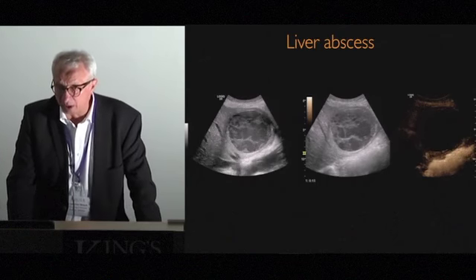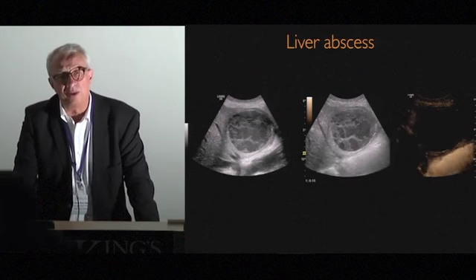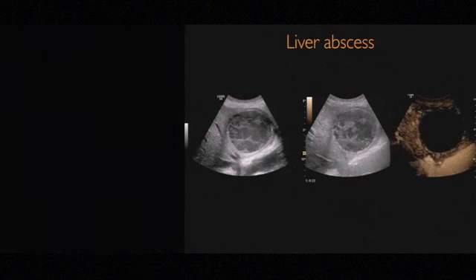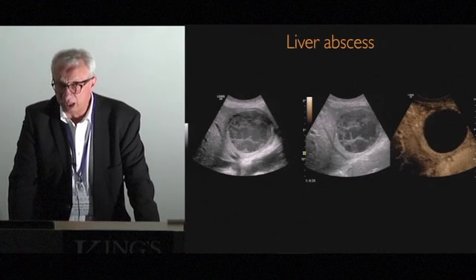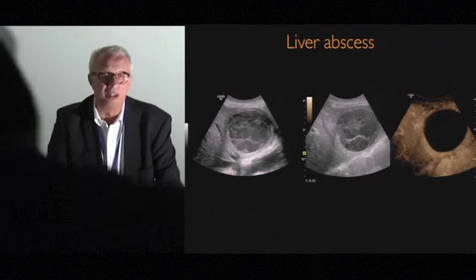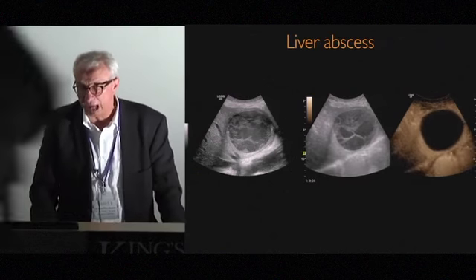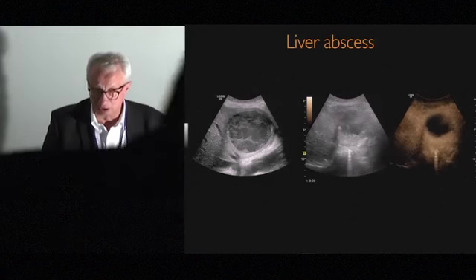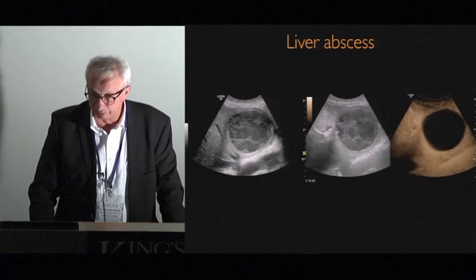Okay, liver abscess, of course, it's an easy diagnosis. This is a patient who had a liver abscess. He had received drainage, and after that, again, he developed fever and pain in his epigastrium. So here you can see it is again a recurrence of this abscess, and you can see the peripheral hyperenhancement around this abscess. So this is typical, like in any other imaging modality. That is not a challenge, I think, for any modality that you use.